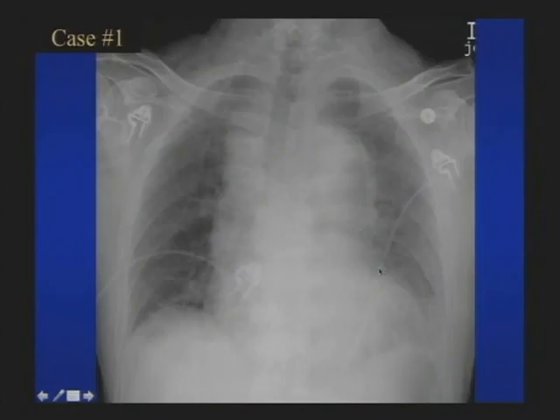Okay, all right, good. So, history of trauma, what are we going to worry about? What's the pattern? Widened mediastinum, right? That's the pattern. Some people misinterpret this as right upper lobe collapse because there's this kind of opacity sandwiched against the mediastinum, but it really is widened mediastinum. And what's the number one cause of a widened mediastinum in the setting of trauma? That's a baited question. It's actually not traumatic aortic injury, even though that's what you have to exclude.